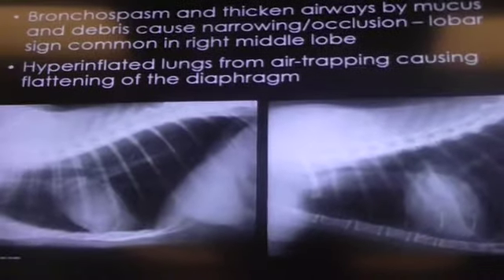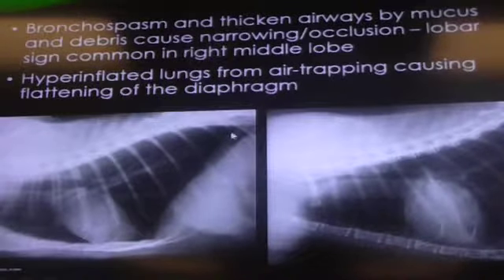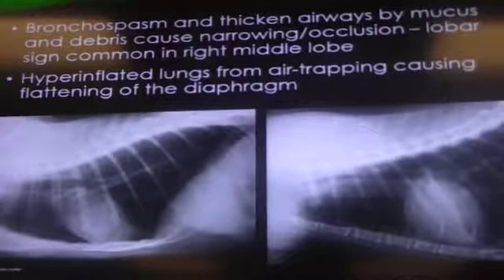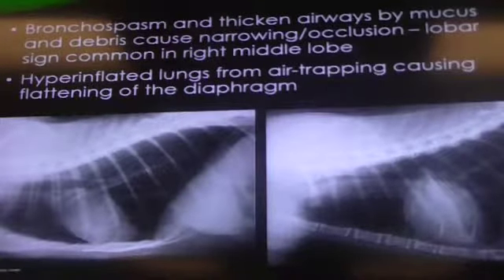A straight line. So this is more stretched out caudally because of increased effort during inspiration. Okay? And the lungs are stretching out to about T13-L1. So they are going past T13. So this is hyperinflation of the lungs. So these two are also signs of feline asthma.